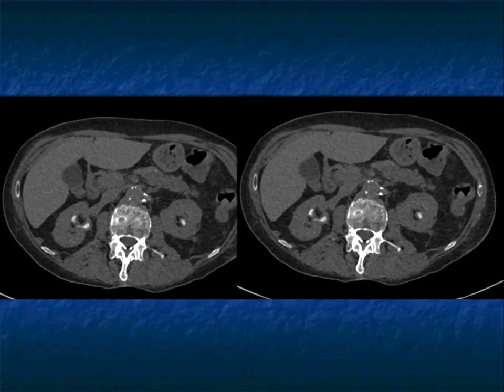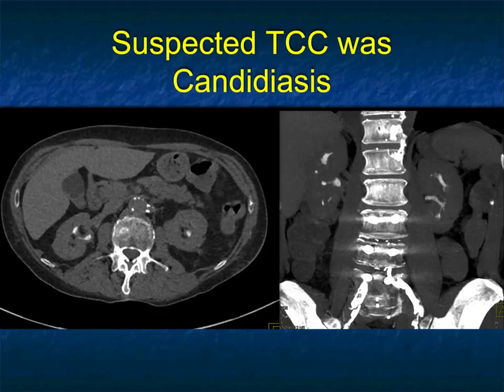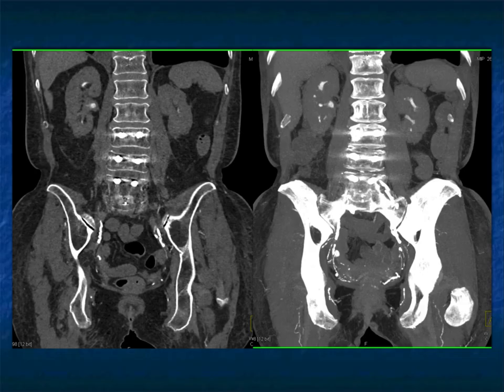This ended up on cytology being inflammatory, okay, infectious. So look at the diagnosis, candidiasis. If a patient's immunosuppressed and the calyces look funny, we think about infection. But bilateral, the stretching, the infiltration, I was worried about tumor.